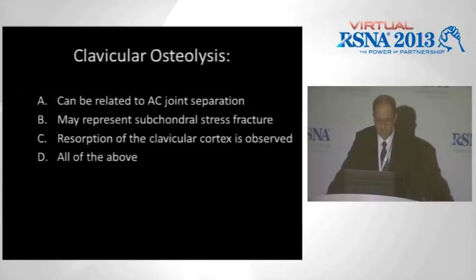Now finally, let's just talk about clavicular osteolysis. This can be related to AC joint separation, may represent subchondral stress fracture, cause of resorption of the clavicular cortex, or all of the above.